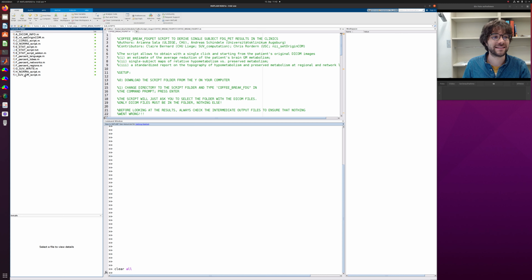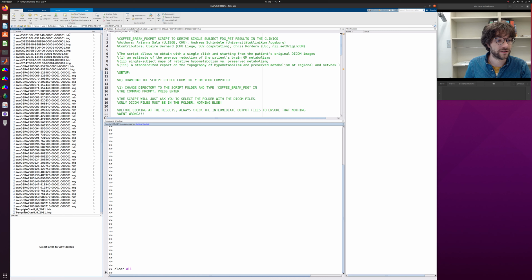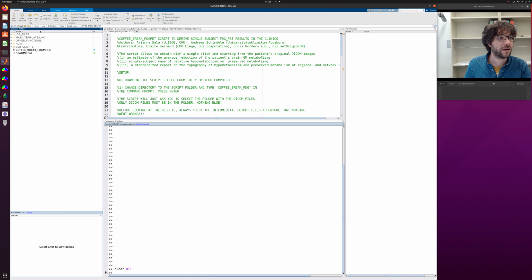And at last, the SUV image is saved in the range that is given, and we also provide the healthy control mean image with the same range, so that they are comparable to each other, and then the absolute values are comparable too. Then we also have our masks here. Here are the healthy controls, and here is a template image. And then there are some other functions and job files that are also used by the subscripts.